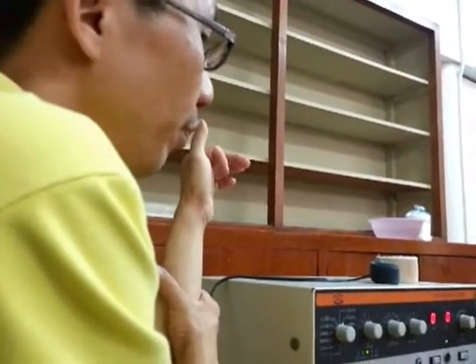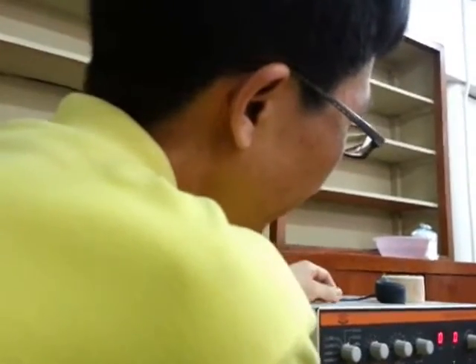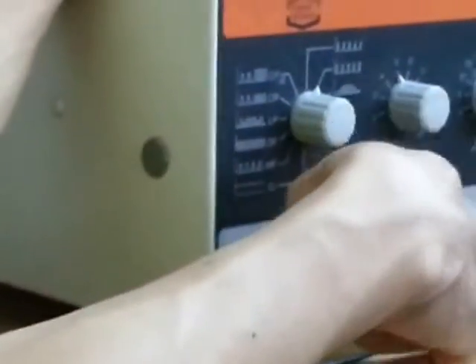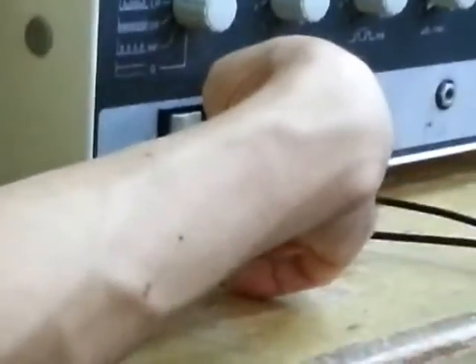So again, with regards to your long pulse duration, range from 100 going up. You have here below, this is a multiplier. So times 0.01, times 0.1, times 1, times 10, times 100. Whatever value you choose here, for example 5, and then you place this times 100, it means your pulse duration is 500 milliseconds. If you place that 2 times 10, it means 50. Times 1 is 5. Here would be 0.5, and here would be 0.05.